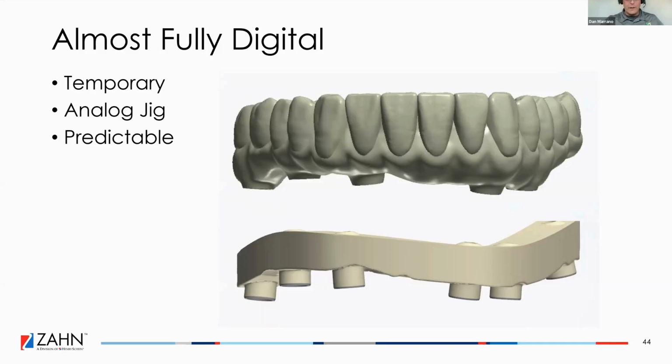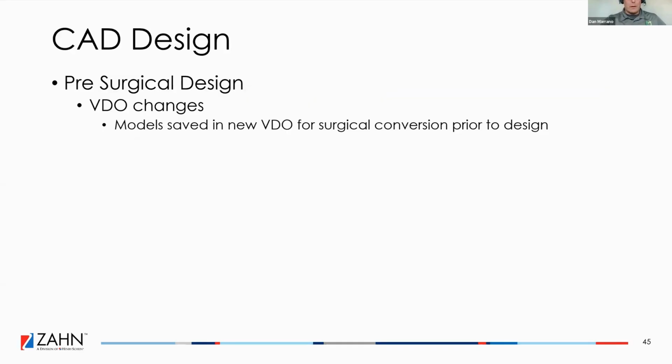So it is a nice workflow for doctors who don't have any kind of photogrammetry method to get accurate implant positions. So our pre-surgical design, now we're going to jump into CAD.